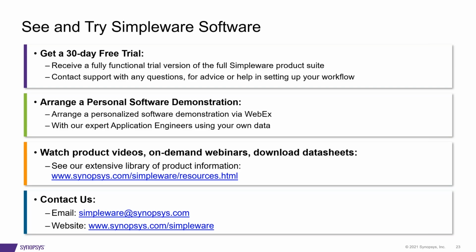And then going a little beyond that is when we get into our machine learning based AI tools. So we have off-the-shelf tools, AS Ortho and AS Cardio, where you can do automatic segmentation of the hips and knees from MRI and CT scans, the ankle, the heart, and we have more in the pipeline coming. But those are not FDA cleared. Those are more for R&D purposes, but we have customers who use them for their workflows, especially within the medical device industry, and they have to clear their workflow anyways, so that's fine for them.